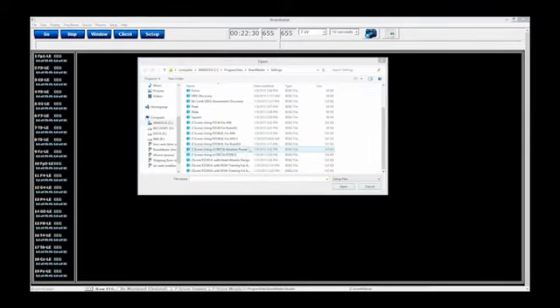Z-scores using sLORETA Absolute Power is focusing on a particular region of interest and training that Z-score band to 0. So you're basically focusing on the frontal lobe delta, or on Brodmann area 47 and beta. You're going to focus on a particular region of interest and a particular band, and try to train that to 0.